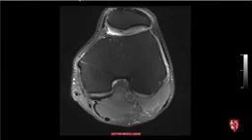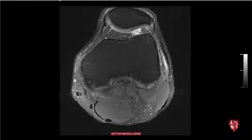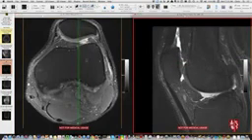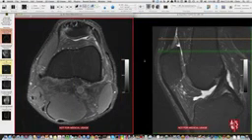It's important when you're on the axials looking at the patellofemoral cartilage not to get fooled by being too high. So if I show it this way, the green line here references where the axial image is. And notice that if we're at this level on the axial image, what we're actually looking at is the upper part of the patella and some patellar cartilage, this stuff here. But then in front of the femur, it's not even cartilage yet. It's actually prefemoral fat, okay?